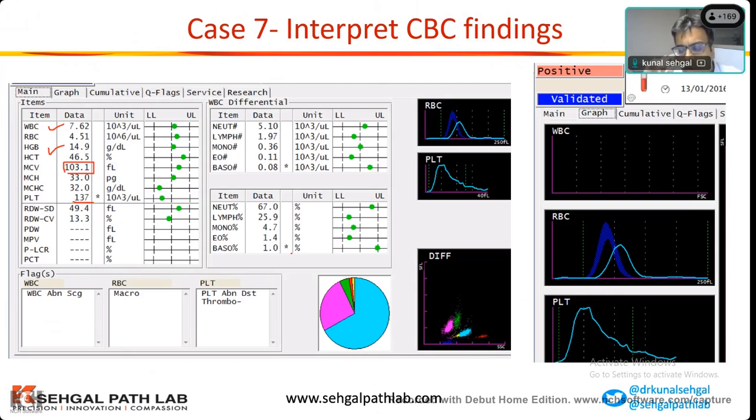A lot of different drugs can cause this. What was important, as you highlighted, you saw the whole information. There was no anemia. But if I said the hemoglobin was 8.9 and the RDW was 18 or 20 or 22, then that is likely anemia, megaloblastic or macrocytic anemia, and you look at the causes.